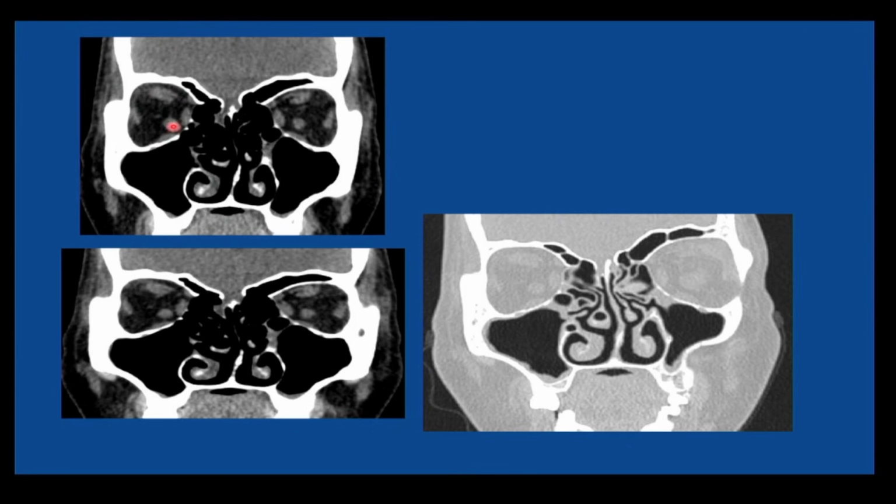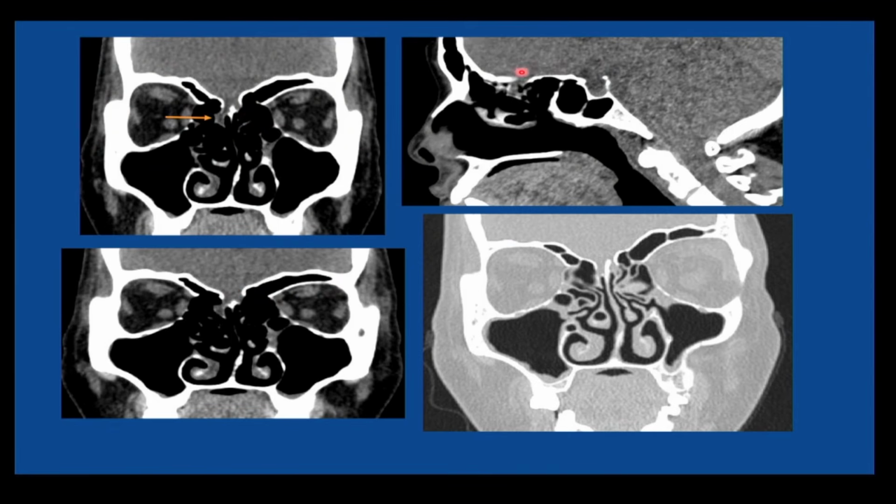Or I could do this CT scan and I will do an MRI which is heavily T2 weighted. Correct? A T2 weighted MRI. But what we decided, we'll wait. So there is this, and also I'm showing you a sagittal image because I want you all to get this in your mind. You have to see sagittal images of paranasal sinus and also temporal.